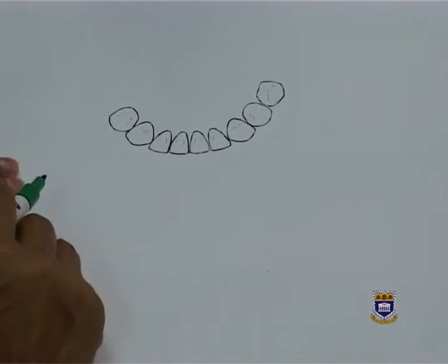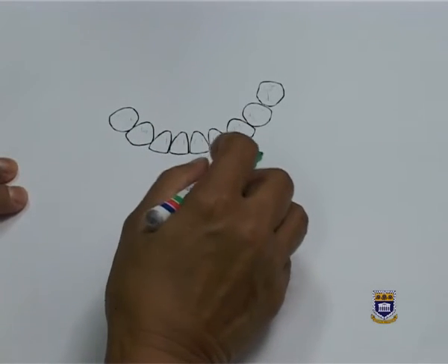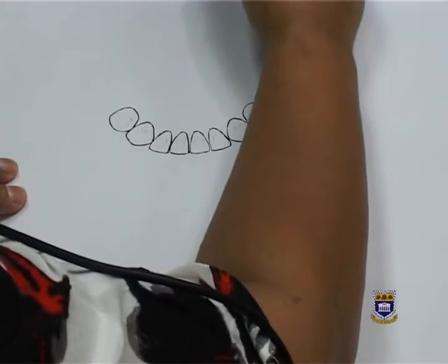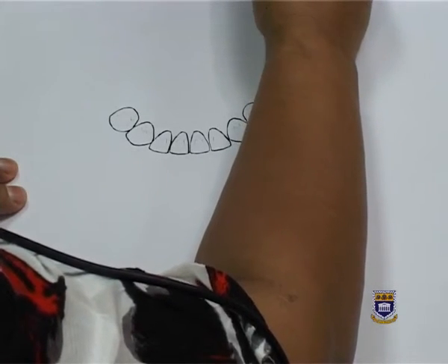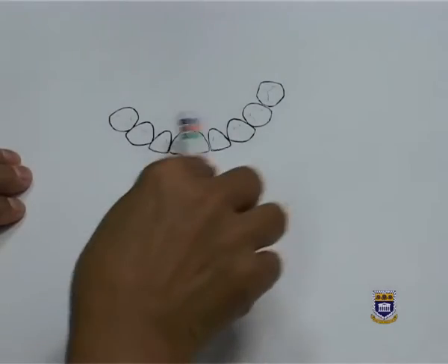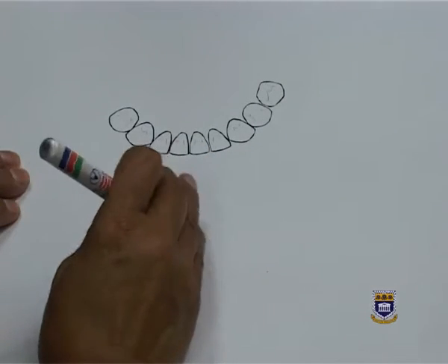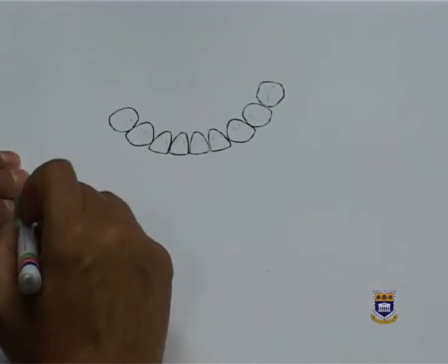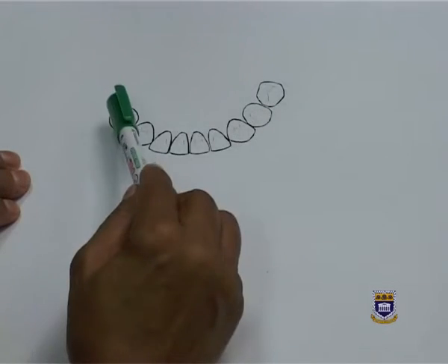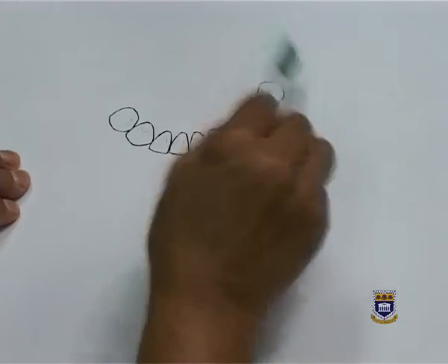This will be my class 1 denture. Very common clinical situation that we encounter in the clinic, and I will be designing a metal partial denture again. And just to refresh our memories, class 1s and class 2 dentures are referred to as tooth mucosal supported dentures, and challenging because we have the problem of having a tooth and a mucosa supported denture.